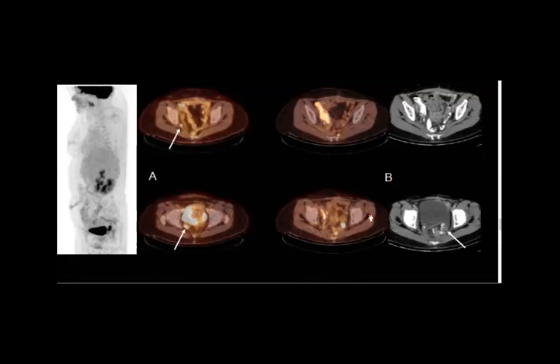So this means that it could be progression or regression. When you see a newly developed lesion, which is not present here, after a few months, he did this one. So this means progression or regression. Perfect, Nermeen. Nice, thank you. So this is what's called progression, okay?